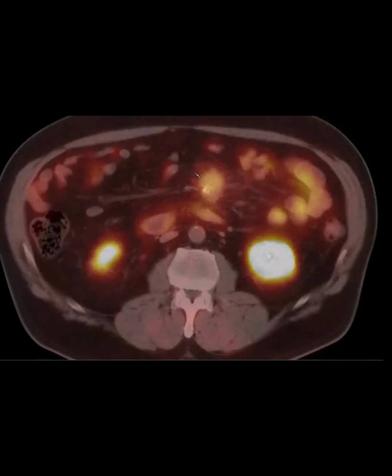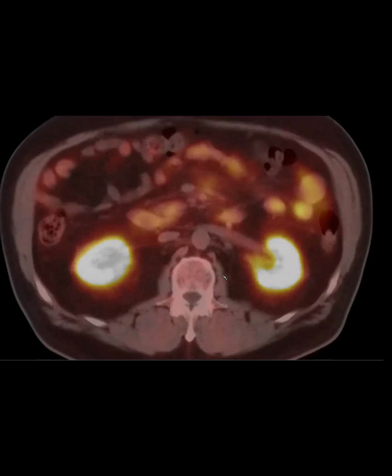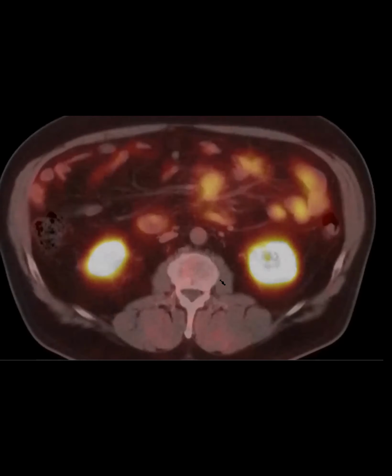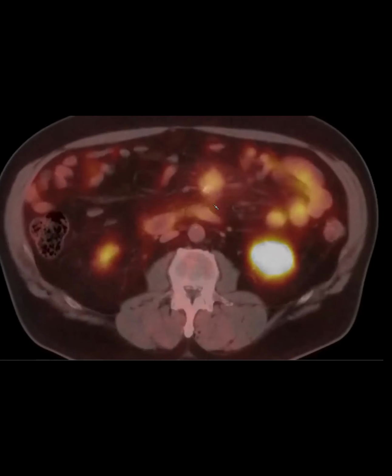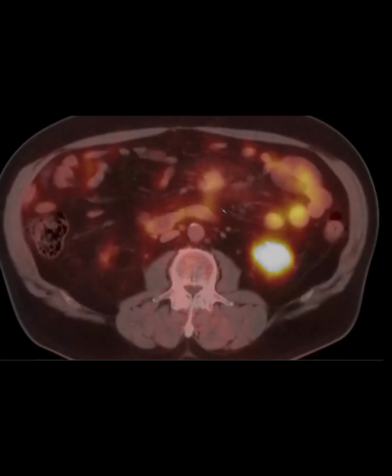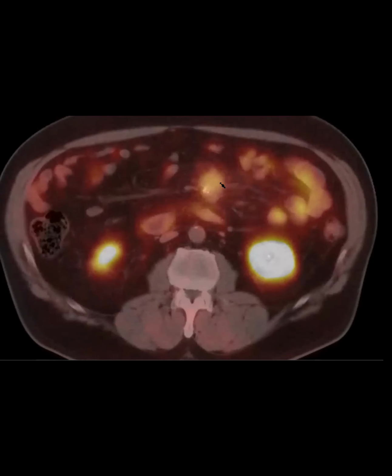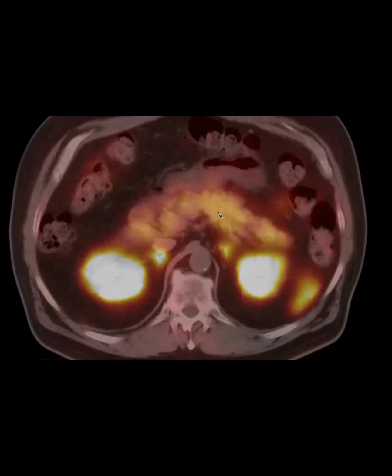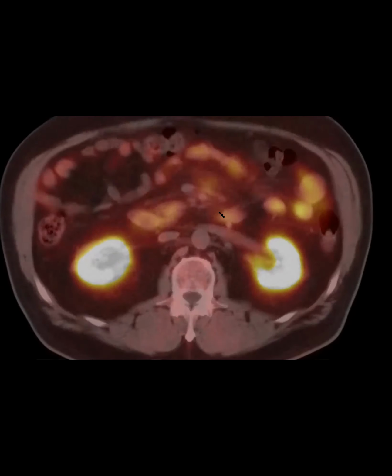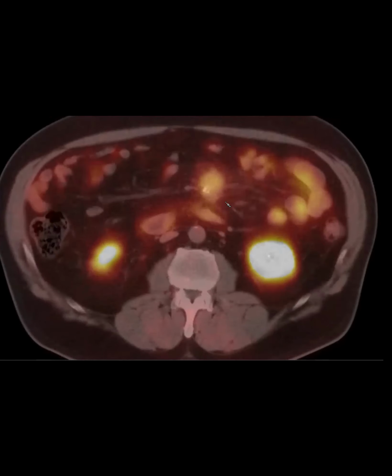So they went in and did a surgical resection of this, and this came back sclerosing mesenteritis. So what'd you say? That's very mass-like. Yeah, and it progressed, like the size progressed, right? Yeah. And so take-home points here are that sclerosing mesenteritis can be avid even on dotatate, but it won't be as avid as a well-differentiated neuroendocrine tumor. And sclerosing mesenteritis can be progressive and can even grow in 6 months or a year.